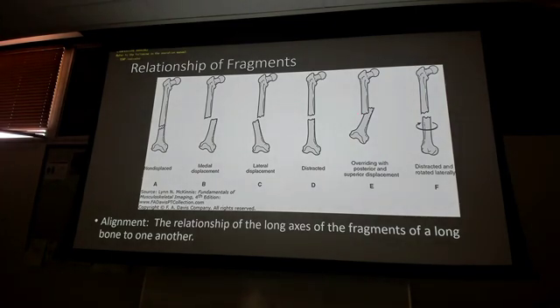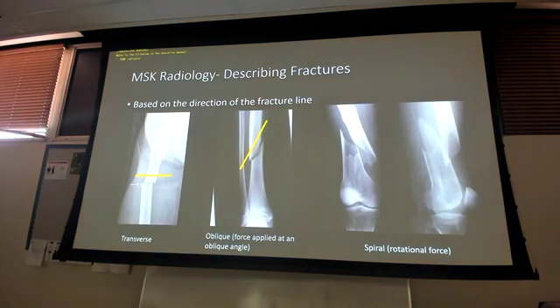If I gave you all the images, you could potentially do that if you needed to, right? I need you to be able to pull out medial displacement, lateral displacement, basic directional stuff, okay? Not gonna throw a bunch of distracted and rotated lateral at you. It's just showing you how you can use all these different words to describe things based off of what you're seeing. Okay?